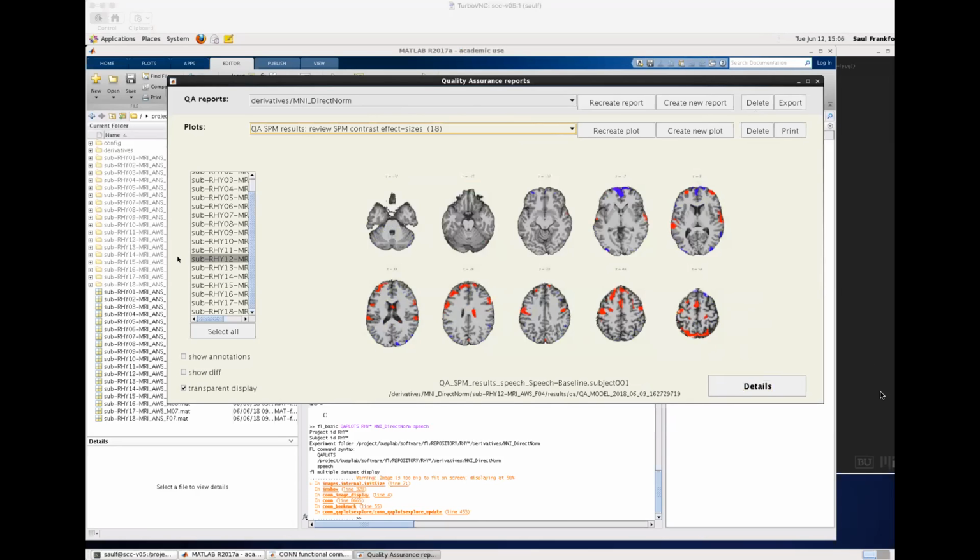This one still shows some level of activation that looks like a true activation, so perhaps it's fine. It's nothing that we couldn't just move on from, because if those two are the worst cases and the rest of the subjects look relatively fine, then these subjects could be flagged just by having higher average motion than the rest.